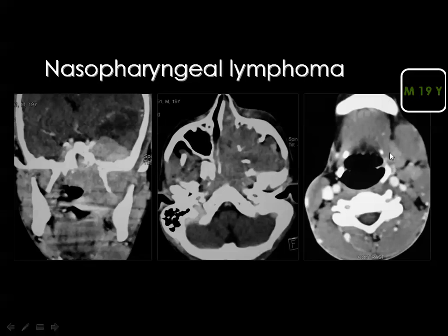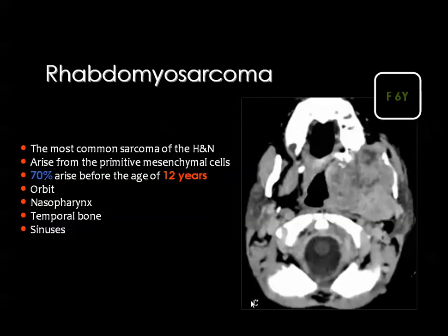This is the submandibular salivary gland, and this is a node, and this is another one, a third one, a fourth one. Then you have bulky, homogeneously enhanced lymph nodes together with the mass in a relatively young patient. Then you consider the possibility of lymphoma.